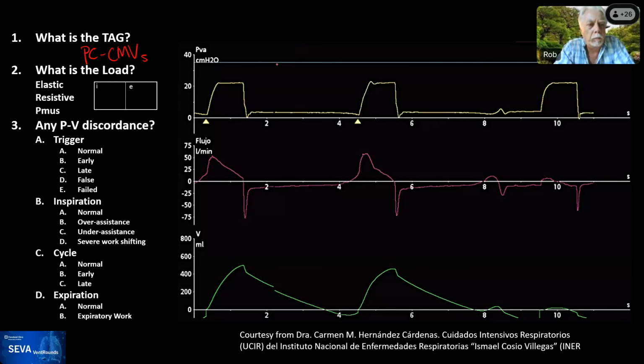Fabulous. All right. I don't see any comments or questions, so we're going to move to the load. And this is as good as it gets in terms of load identification. As you know, we usually divide them into inspiration and expiration. So during inspiration, you can read. And we said that if we're controlling pressure, we're going to look at the flow waveform.